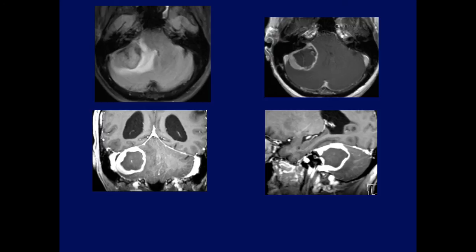What about this cerebellopontine angle lesion? It does not look like the typical meningioma. And this was a grade 2 atypical meningioma. It's kind of an unusual way of enhancing. May have been necrotic in the center, but this is a potential malignancy. Unusual appearance, however.